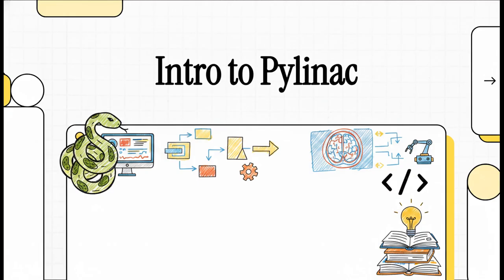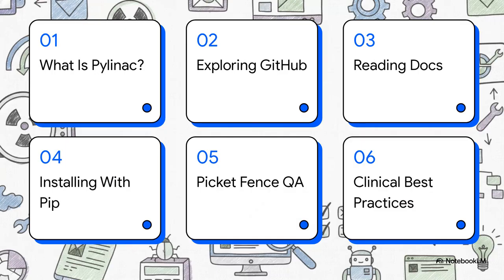Today we're diving into one of the absolute most powerful open source tools in our entire field, and that's Pylinac. Now look, if you have little to no Python programming experience, just take a deep breath, it's totally fine. We're going to take this step by step together, and I promise you, it's going to be a really fun journey.